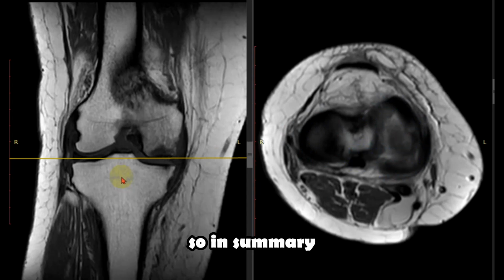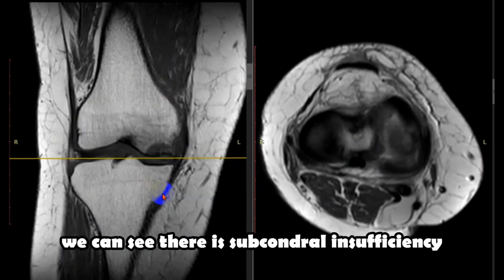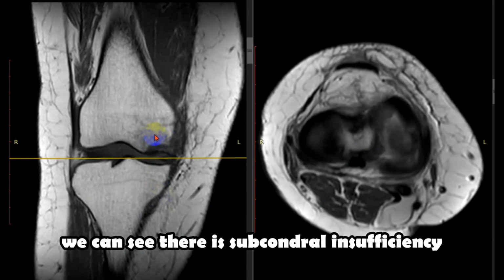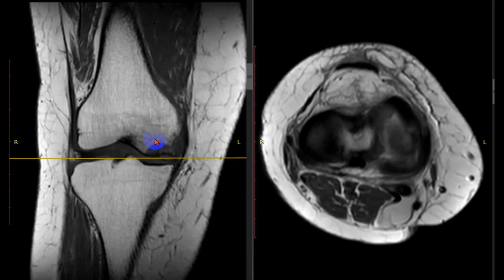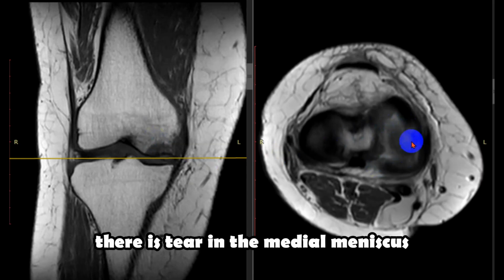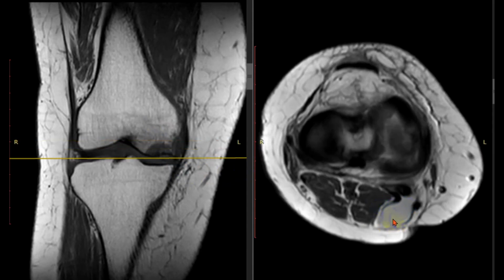So in summary, we can see in this MRI image of the knee joint, we can see there is subchondral insufficiency fracture of the medial condyle of the femur. There is tear in the medial meniscus and there is Baker's cyst.